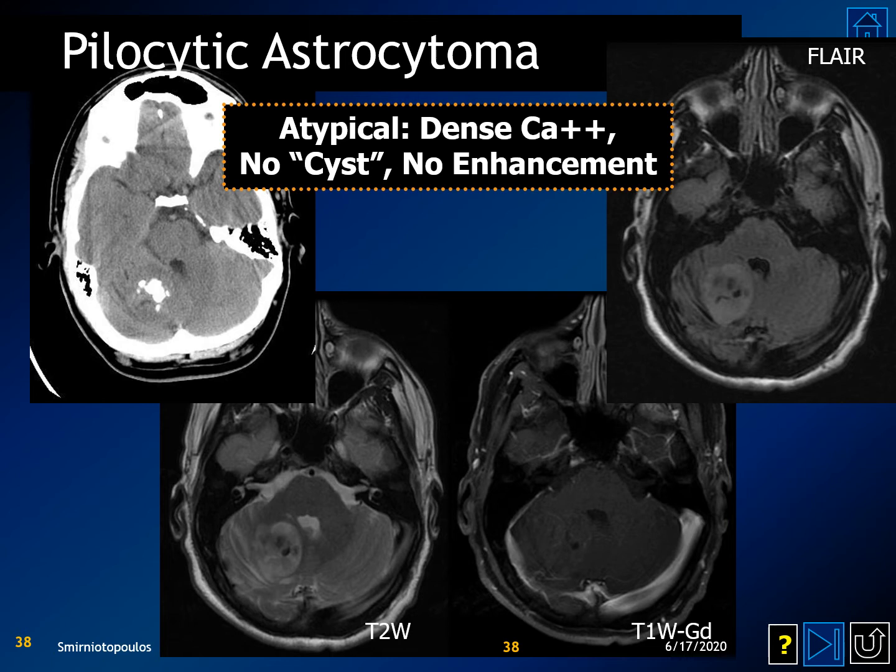The patient was 42 years of age. The calcification in the cerebellum was identified on a screening exam after a car accident. We can see that this lesion has no contrast enhancement and no fluid. Because of uncertainty, it was biopsied, and the biopsy was a pilocytic astrocytoma. It's been suggested that pilocytic astrocytomas grow primarily within the first 2 decades of life, and if the patient makes it to their 20s without having the tumor identified, they may become dormant. And the pathologist described this as a burned out pilocytic astrocytoma.